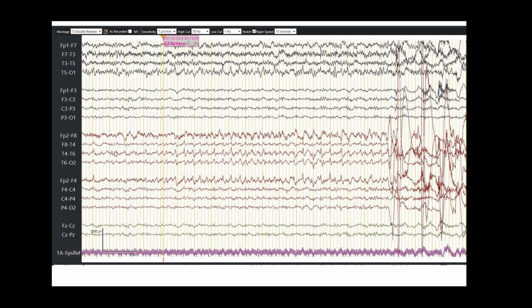You see between F8 and T4 is the localization, and you see the spikes become more and more frequent and start recruiting more cortical activity. The surge becomes stronger and overcomes other neurons and other cortical areas to become more synchronized. Then you start getting it also in the frontal area, so it's temporal and gets involved in the frontal as well.